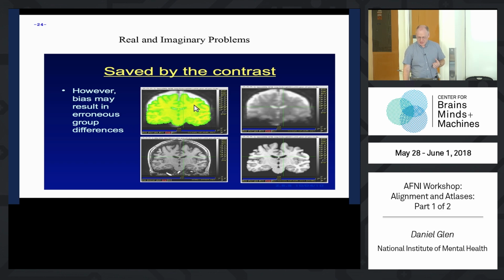And that's what we're seeing here. So the alignment actually did work because we are aligning that CSF to that CSF. So in the end, the procedure was correct, and it's just by looking at the contrast of the CSF on the original data sets, you can see where things are.